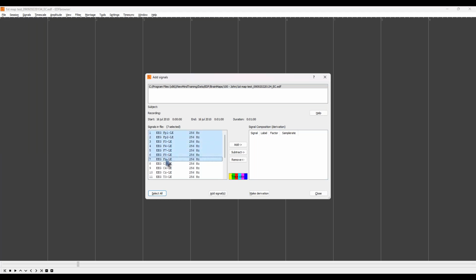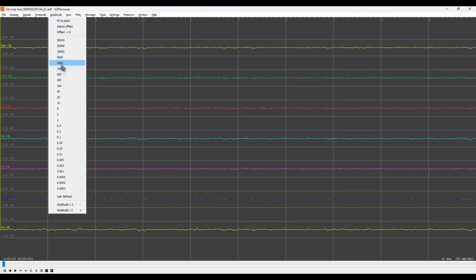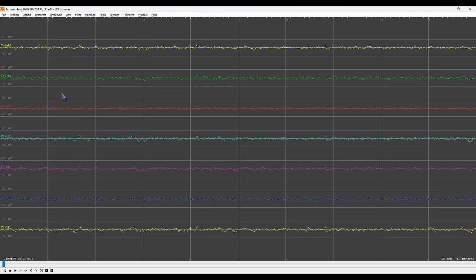Before you leave this screen, you can adjust the montages somewhere on that, right? Yeah, that's up here. Because that's a nice way to look at frontal versus rear or left versus right. You can adjust it however you want to.